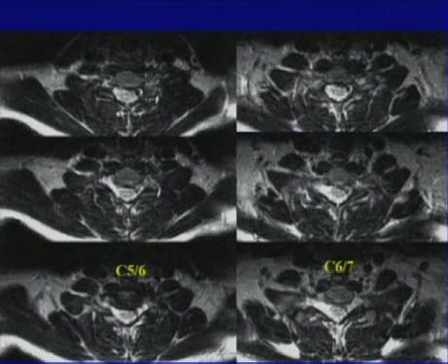This is where the axial images are very helpful. So here at the C5, C6 level, we can kind of see this little outpouching. Get the hint that there is a nerve root, but as we get to the C6 and C7 level, again, we have a pseudomeningocele formation, and we have absence of the nerve root coursing through the neural foramen. And this is helping us identify the avulsed nerve root as well as the pseudomeningocele formation.